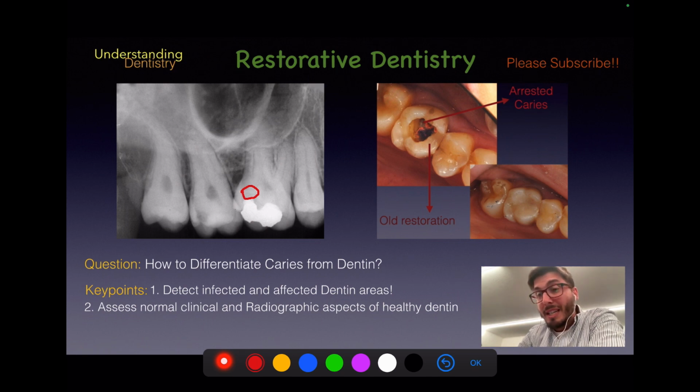We also need to take into consideration that this tooth has periodontal ligament space widening, okay, as we can see here, depending on the root, but we can see that this is actually happening here. So we need to consider the different situations of the radiographic aspects of the dentin. And this, you are going to correlate with the clinical situation of the patient, right?